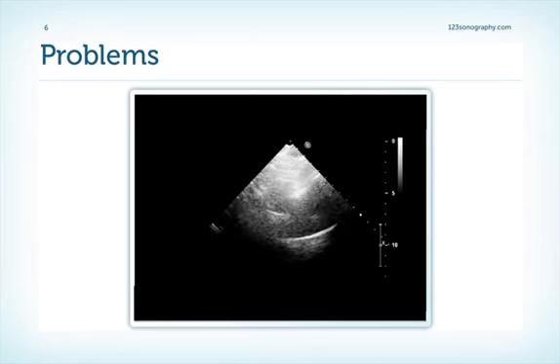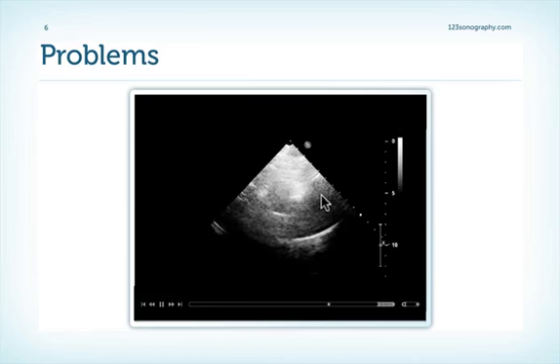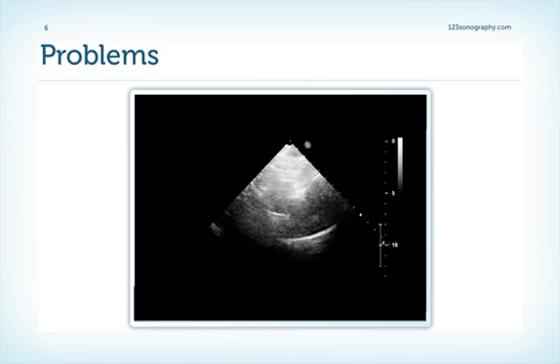Now, the patient I investigated had a known dissection in the abdominal aorta, so I was kind of convinced that dissection was also present in the ascending aorta, which is an indication for operation, and that's where I actually sent him. Well, fortunately, we also performed a TEE study, and there was no dissection. And we also performed CT, and there was also no dissection. What we saw was an artifact. As a matter of fact, an artifact which is not so infrequent. This is a reverberation of the aortic wall, a form of artifact that I will be discussing in this chapter.